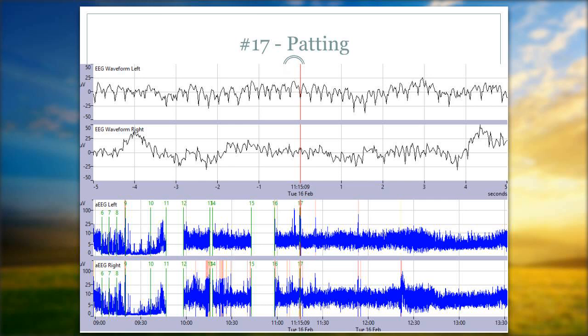We don't have video, especially on the standalone brains device, and so we can't see that someone was just patting and consoling the baby here, but someone documented it. So then as we went in, we could actually see, look how rhythmic it is. You would think that's potentially seizures, but thankfully for the documentation, you know it's not. So I can't say again just how important it is that we document and mark those events as we're doing them, as close to real time as we can.